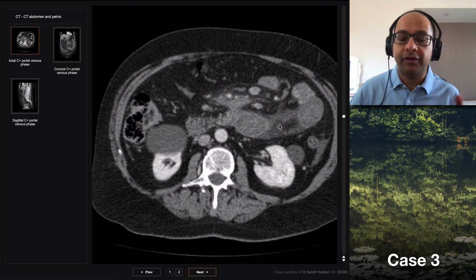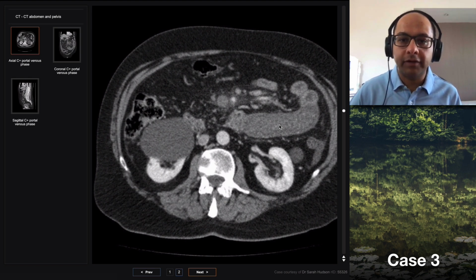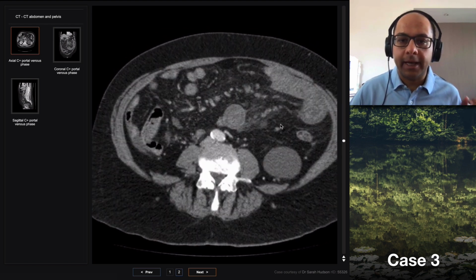And in fact, I don't have the follow-up for this patient, but I know that follow-up study 4 weeks later, because they stayed well, they were anticoagulated, and the small bowel recovered to normal, and the clot began to retract within the portal and mesenteric veins. But the target sign is a very important sign to look for with venous small bowel ischemia.